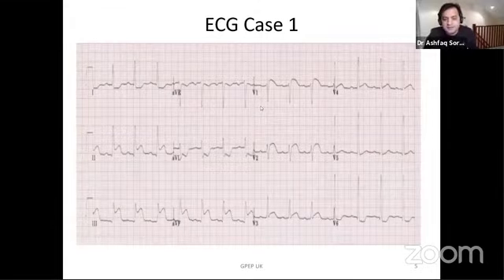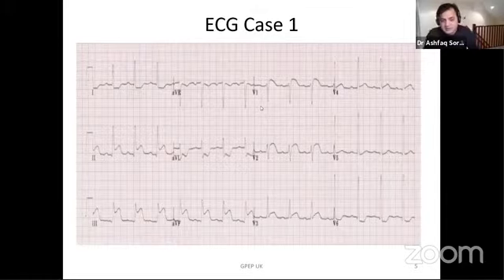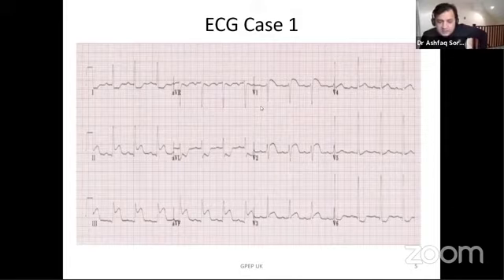All right. Now, why? Always remember, whenever you have an inferior lead MI, you have to be very, very careful. Don't just jump to the conclusion. Inferior wall MIs can be aortic dissections because the aortic root dissects at that level. So be very, very careful before you jump to the ACS protocol. Now, if you look at the pattern, in V1 and V2, there is an ST elevation.